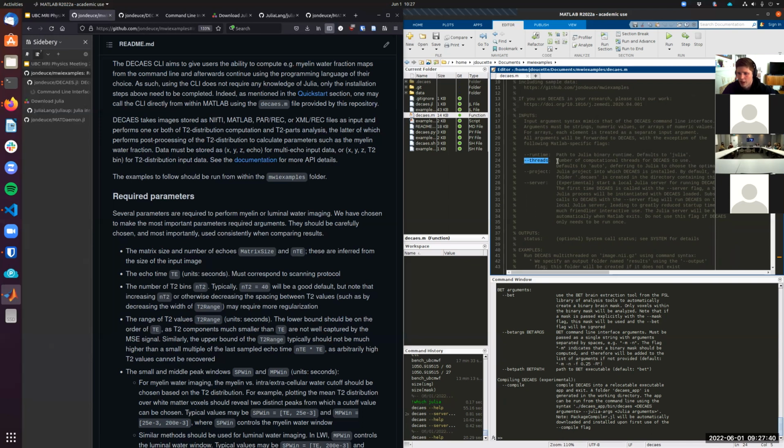Then there's the number of threads. This will actually be chosen automatically now, but you can manually set it to something smaller if, for example, I might have to do that depending on how Zoom handles the decaes running while running the Zoom.